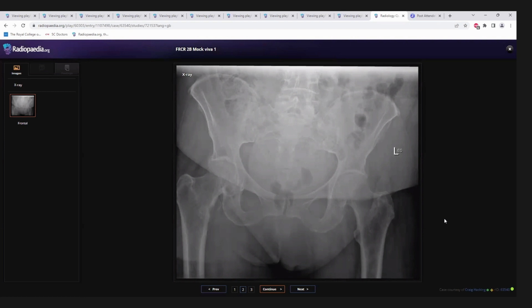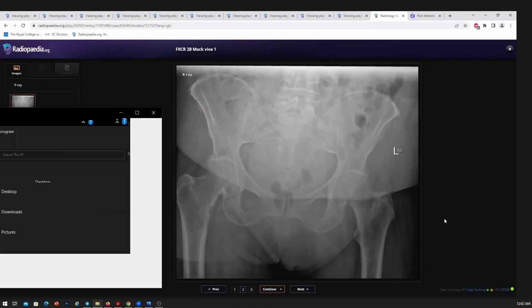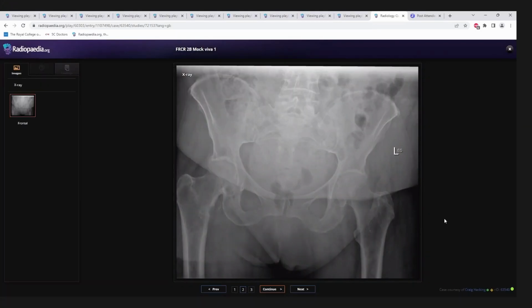This is very important. Okay, this is the frontal projection pelvic radiograph of an adult patient. Here in the femoral neck on the right side, the medial cortex is showing a small focal defect over here. And I'm comparing it with the opposite side, which is appearing smooth. So I'm suspecting that there's a probable lytic focus, so I would look elsewhere in the rest of the bones as well to see if there are any other lytic lesions.